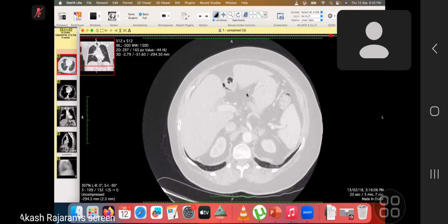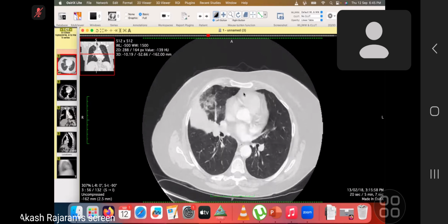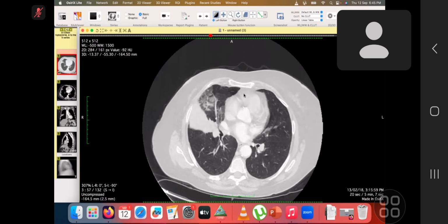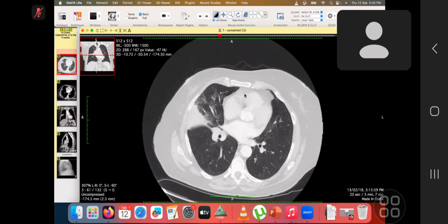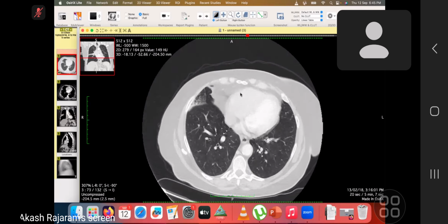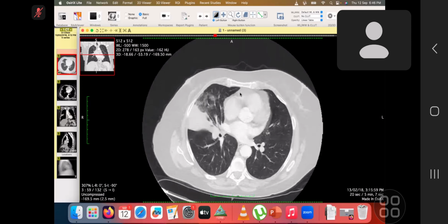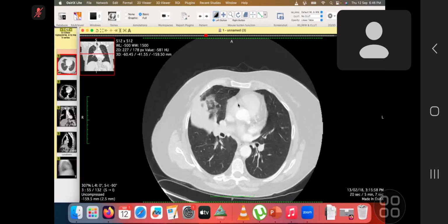So I'm presented with a contrast enhanced CT of the chest. I'm just scrolling through the images. Just within the right lung, there is a dense region of airspace opacification with associated ground glass opacification as well. There is some mild interlobular septal thickening within this region. I'm not seeing a definite cavitating lesion that I saw on the chest radiograph. I can't see any air bronchograms through the dense region of opacification.